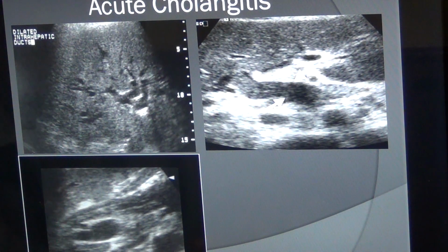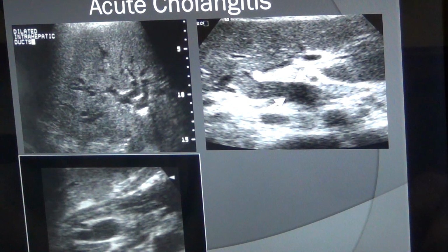You should diagnose the case. And for the sonographer in the USA practically, you have to help the radiologist to do a quality examination. You should provide quality images in order for the radiologist to diagnose the case.